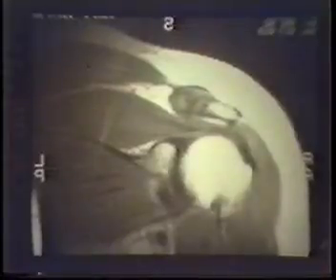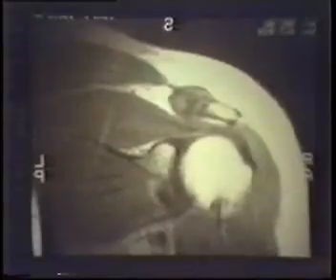As the tendinitis progresses, there is a continuum into small partial tears. Small partial tears can look just like we're seeing here. So I don't think by MR we can distinguish tendinitis from small partial tears. But what I think is important, though the surgeon may think otherwise, is first we've got to decide whether the rotator cuff is abnormal. If the rotator cuff is normal, then we can tell the surgeon that we don't think that the patient's symptoms are due to rotator cuff disease. And that's actually important. And that's actually something that's not easily determined otherwise.